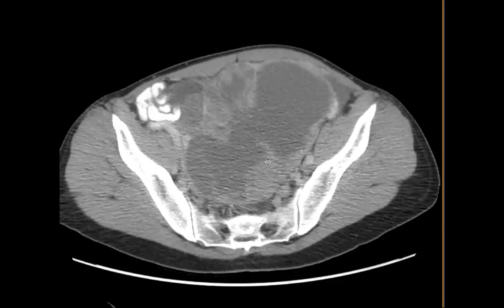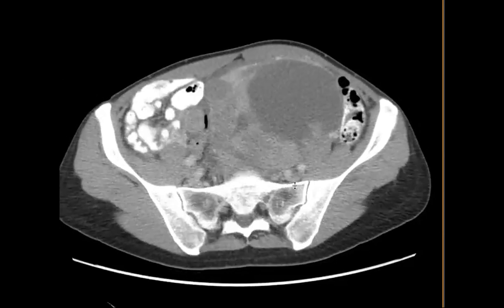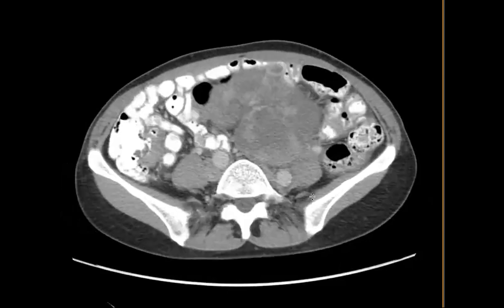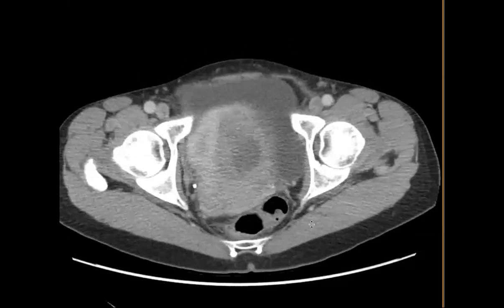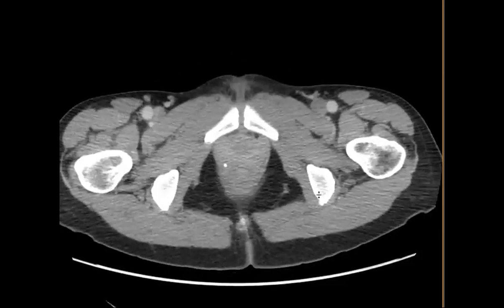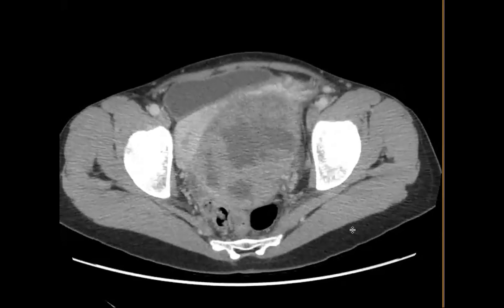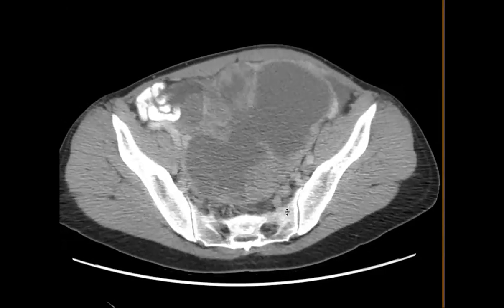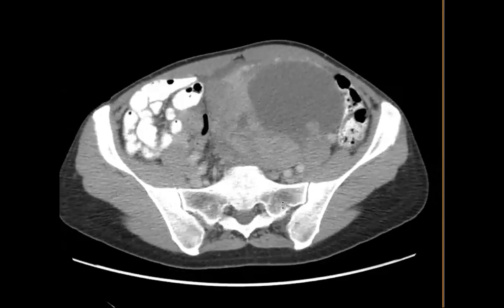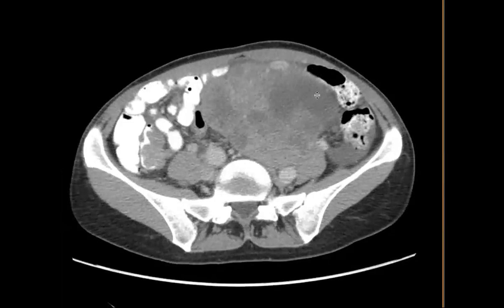So what would your thought process be, looking at this? There's no ascites, bilateral ovarian masses. So I guess stromal tumors, if it's such a big lesion with no ascites, but surface epithelial tumors can still be big. And then malignant. Yeah. Or Krukenberg, yeah, exactly. Yes, or Krukenberg. So as you scroll through the scan, I'm going to stop right here.